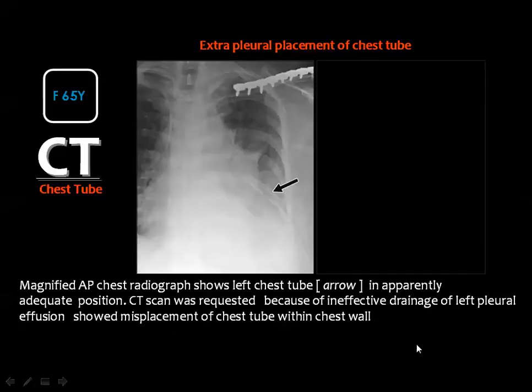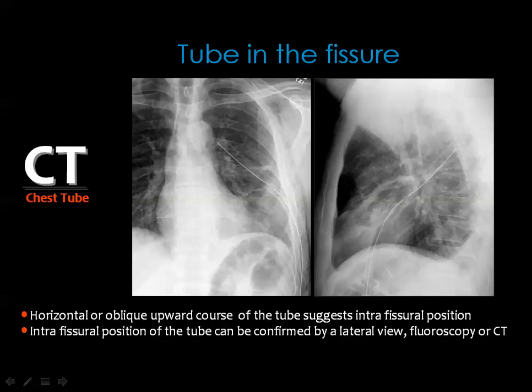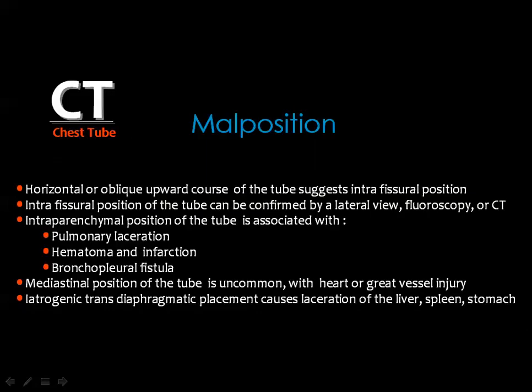And if you look at this chest X-ray, you can see that the tube is draining this amount of pleural effusion. It looks in a good position, but the CT scan and this is, sorry for this.